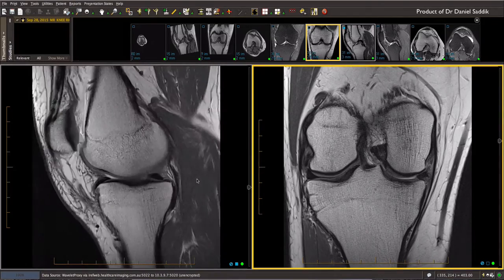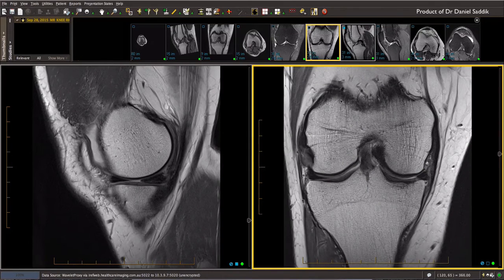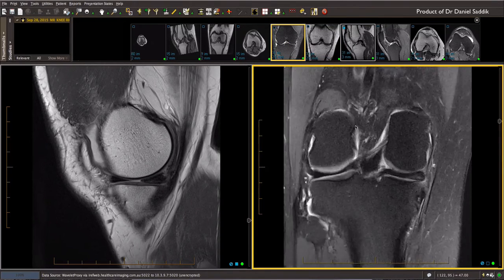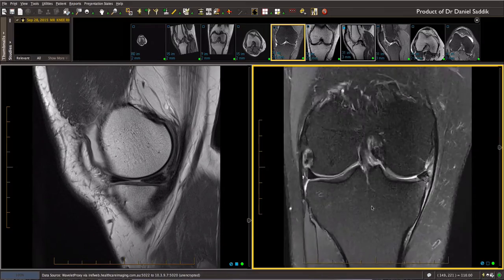The next thing I would go on and describe, I'd look also for perimeniscal cysts before moving on from the menisci, and perimeniscal cysts are best visualized on what we will call PD fat saturation imaging. Some people call it T2 fat saturation, and that's fine. And that's important sometimes to say in the body of the report, T2 fat saturation. So I'd say PD and T2 fat saturation if I give a technique. The reason why is clinicians understand the term T2. They find it hard to understand the term if you just say PD. They need to hear T2. It's something that they're aware of. And the reason why we look at the T2 with regards to the meniscus as well is because we're looking for a perimeniscal cyst, which this patient doesn't really have evidence for.